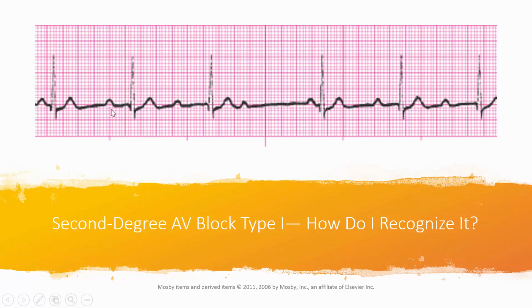So here's a PR interval right here. Now let's look at this one. Here, what do you notice about this PR interval? Compare it to this one. See how this one is getting longer? Okay, well let's check out the next PR interval.